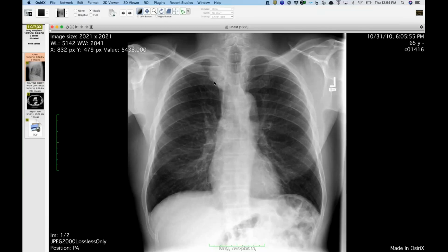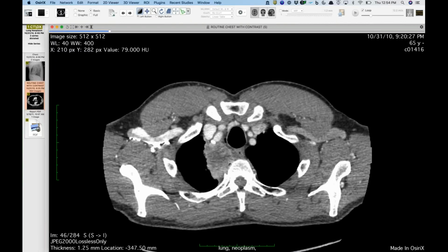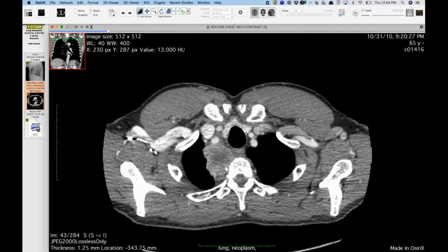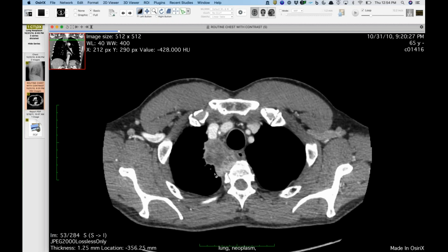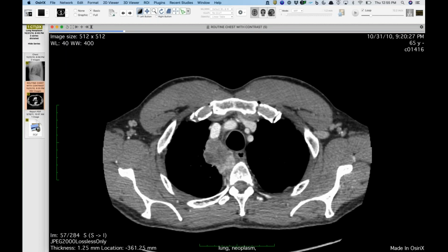And you can see sometimes in this area, we think about just tortuous vessels, but usually, as Howard would describe, they have that lack of a cervicothoracic sign, where you just lose the interface at the anterior mediastinum with a tortuous vessel. But this certainly looks more like a discrete mass, and you'll see that this is posteriorly located and presumably involving his sympathetic trunk here. So the sympathetic trunk gets knocked out, so you have ipsilateral miosis, ptosis of the eyelid, and then anhidrosis would be the other part of the classic triad. And of course, there are other sympathetic symptoms you can have that I don't really remember at this point, but this was a true Horner syndrome from a lung cancer.